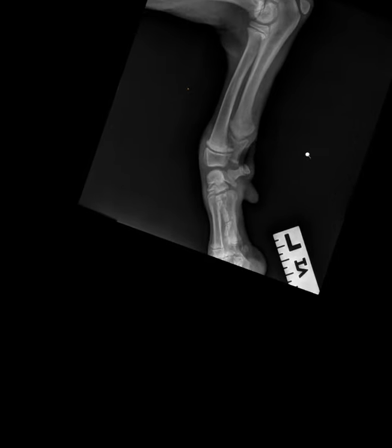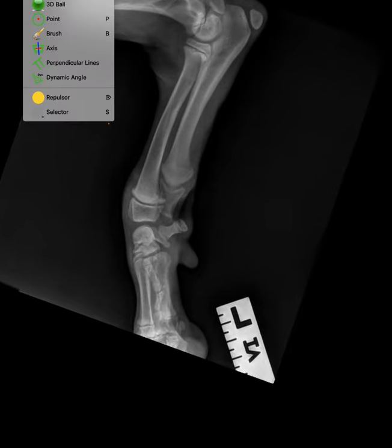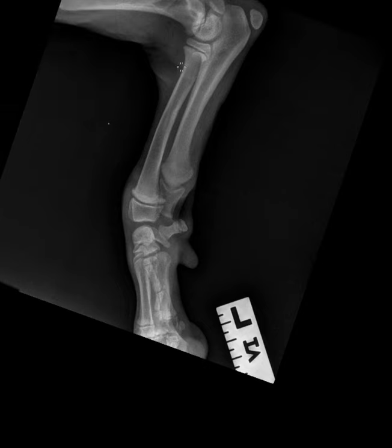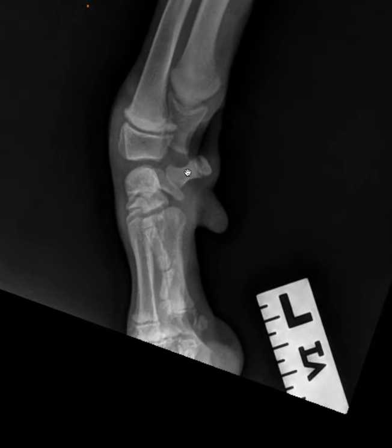So when I'm doing my B for bone within my ABCDs, I do exactly as we discussed last week, and I essentially look at all aspects of the bone on all views. If I were starting here with the radius, I look at the cortex, the medulla, the endosteal and periosteal surfaces, and I trace that all the way. What I want to spend some time on is what happens when you're in the middle of your happy B for bone routine and you come across the physis. What sort of subroutine do I incorporate when I'm looking at a physis?